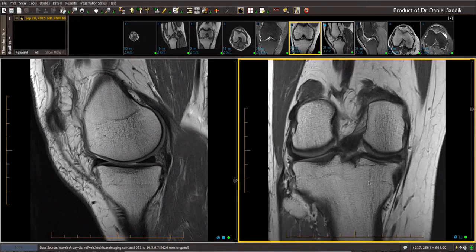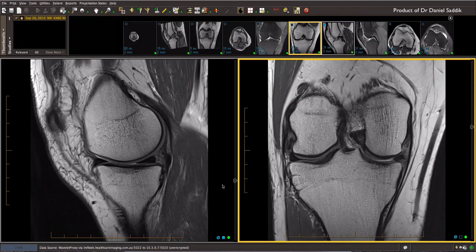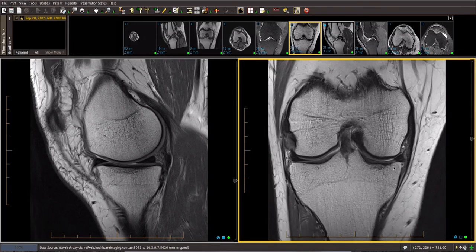The other thing you have to bear in mind about cartilage is this. The cartilage can appear thin in a patient, and you could argue maybe there's minor diffuse chondral thinning of the cartilage. But saying that, often that does not translate arthroscopically. In other words, it may appear thin, but in fact it might be normal for the patient. And when they do an arthroscope, they don't find anything. So I tend to use the term either more significant diffuse chondral loss, or I use the term focal chondral loss. So for example, in this patient, we can see that there is chondral loss here.